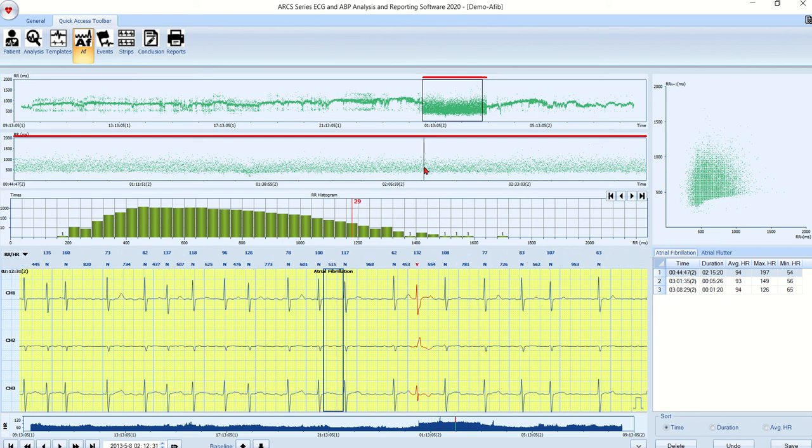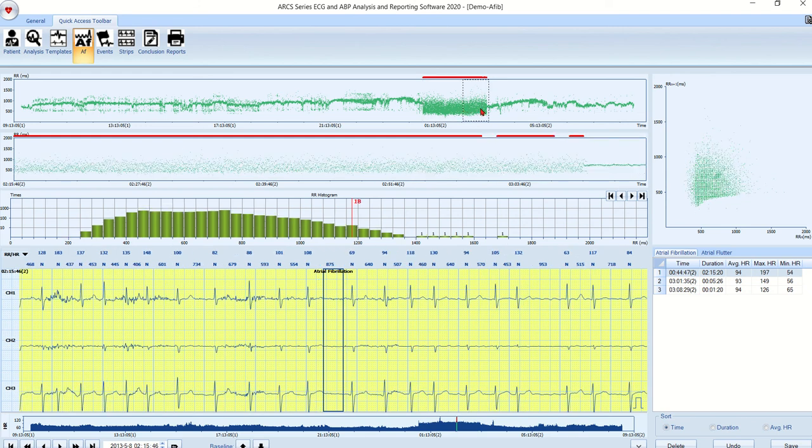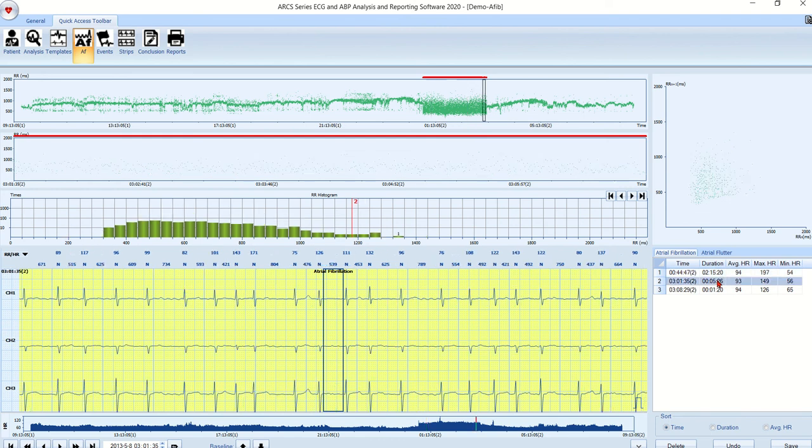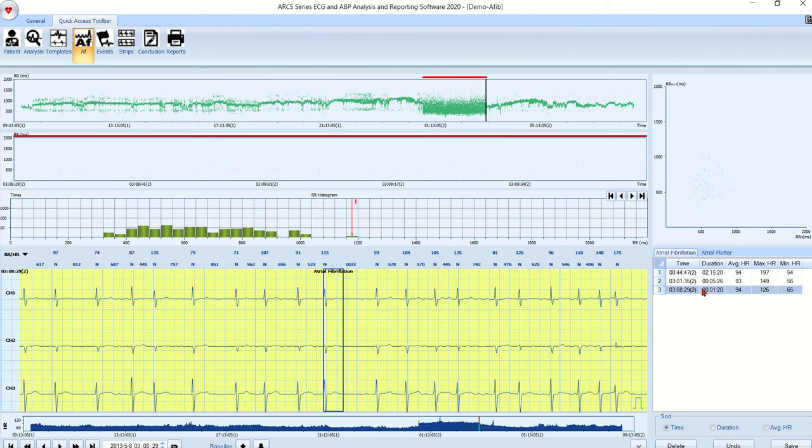If you choose to look at the histogram at the top, you can create another box, and it'll redefine what it's showing you. But if you go back to the beginning, looking at the session on the lower right, and click on that, it'll show you that particular session that I identified, and the third line will identify that.